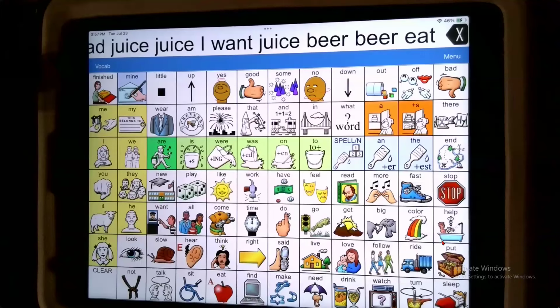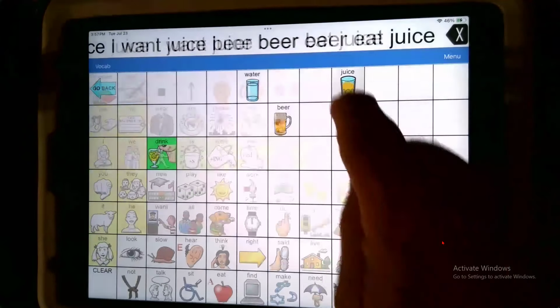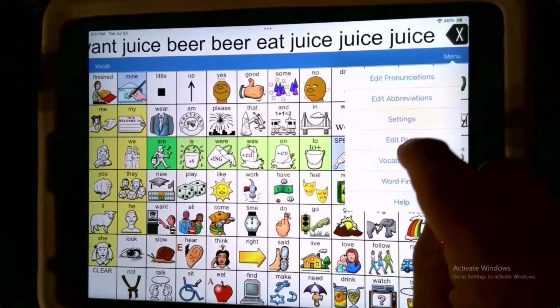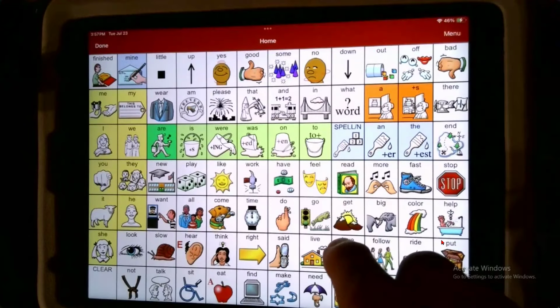All right, that probably slaughtered it. Let me do one more quickly. To take this one back to one hit, juice, all I'm going to do is tell that button, juice, instead of visiting drink, speech message. So this button now is at the navigation mode. What I'm going to tell it to do instead is I'm going to edit that page, edit this button.